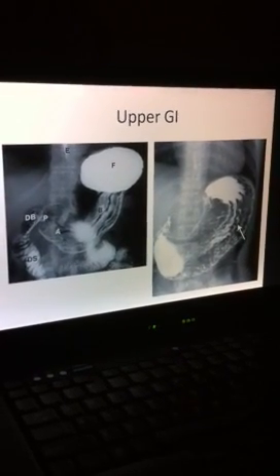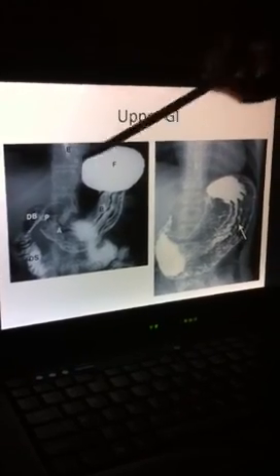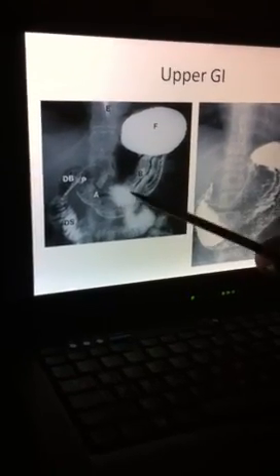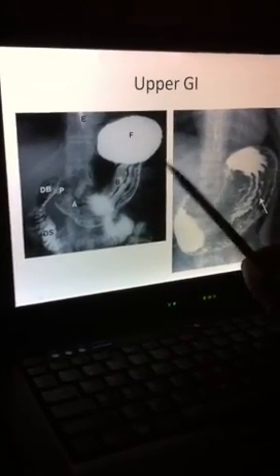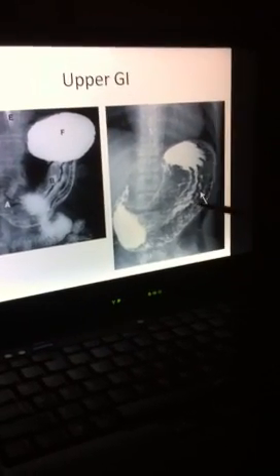The barium continues into the abdomen, and then you have an upper GI series. So the esophagus over here is going to dump the barium into this structure right here, which is what? The stomach. The stomach is labeled, so it's not really too difficult, but this right here. Fundus. Body. The antrum, and pylorus. Yep. And then this. Duodenum. So yeah, the barium just keeps continuing, and here's another view of the stomach, and here you can see the rugae really well.